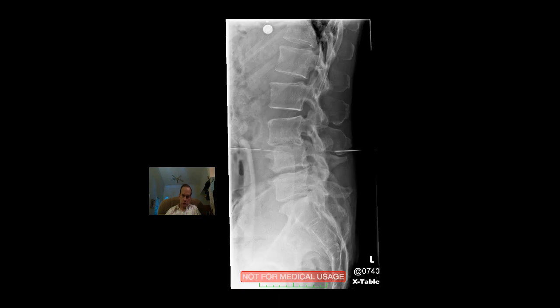Then always good to look at our regular radiographs, and you see, although these end plates look very compromised and somewhat degenerative, they don't begin to look nearly as abnormal as you can see on the MRI.